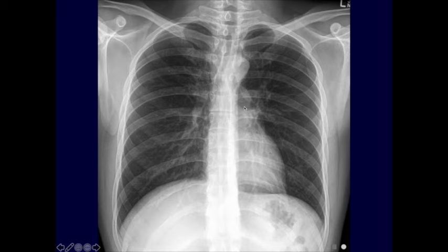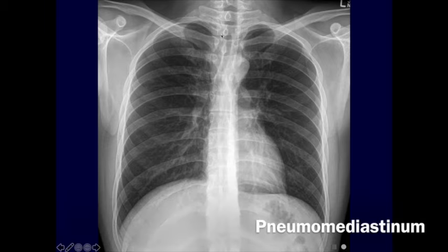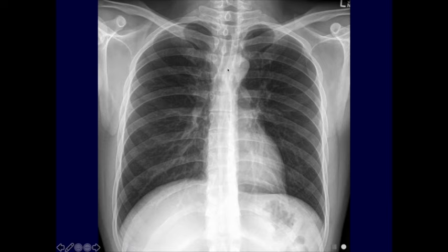In pneumomediastinum, you have gas throughout the mediastinum, which often dissects more superiorly in the mediastinum and then up into the neck commonly as well. As a general point, whenever you see air anywhere where it's not supposed to be, you need to figure out why it's there. I like to break this down simply by breaking it down into 3 categories.